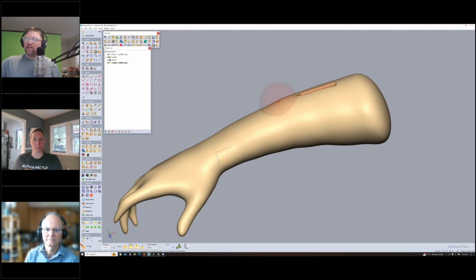So this is the hot lava tool. What is the official name, Kevin? The smooth tool? It's right down there in the bottom left, hot wax. Hot wax. So we're close, hot lava, hot wax. So we've cleaned that up.